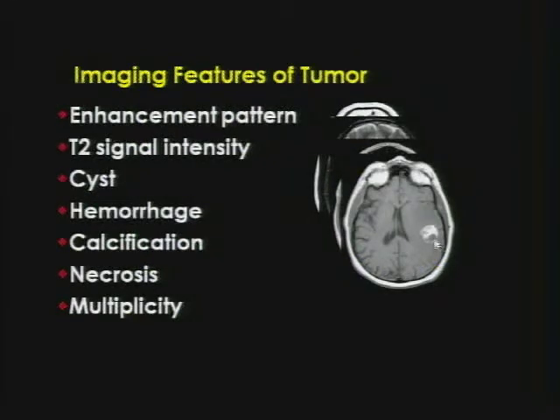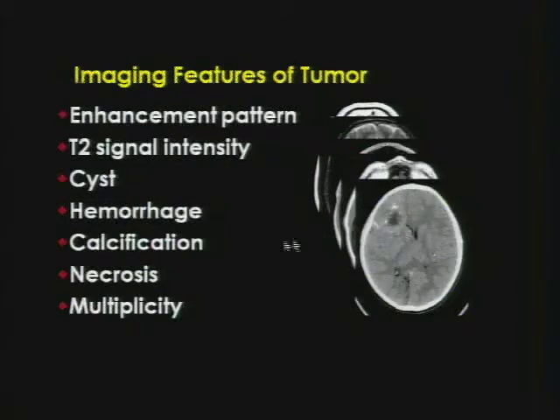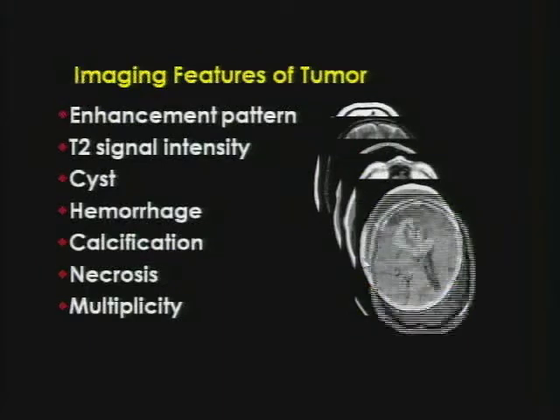Non-contrast T1 weighted imaging showing you a bright T1 mass. This is a hemorrhagic metastasis, but this could be a lipid-containing mass. Just remember, CT is the best test of choice to look for calcification. I'm going to show you an example later how MR can completely underestimate CT calcification. So if you want to confirm the presence of calcium, CT is the way to go.